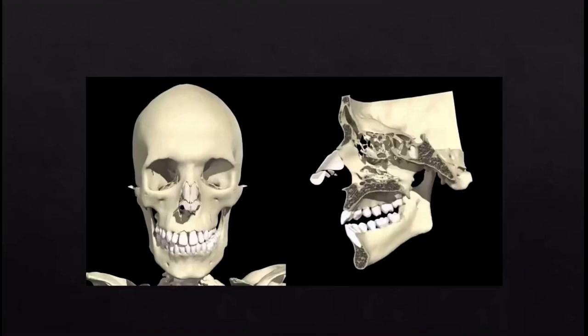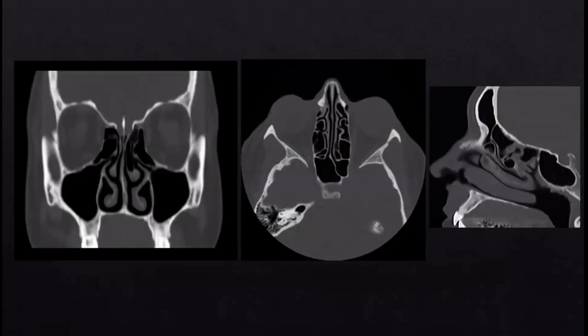They're relatively straightforward because they're named after the bones that they live in. So there are 4 pairs of paranasal sinuses: maxillary, frontal, ethmoid, and sphenoid. And as I say, they're named after the bones that they reside in.